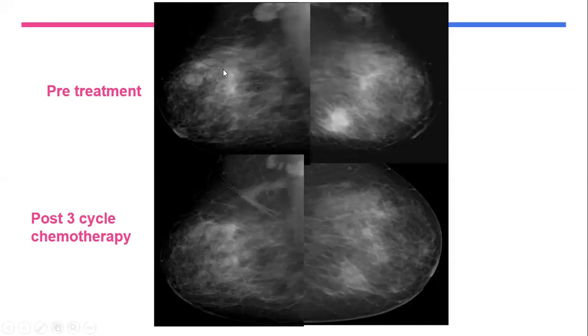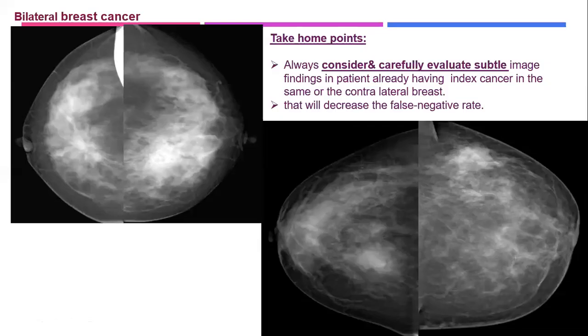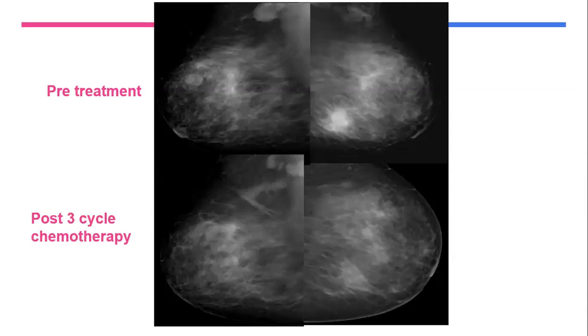You see, even there are some asymmetries, multiple asymmetries, and the one adjacent to the cyst regressed on follow-up. But I suspect this asymmetry, like in the contralateral breast, there are also a lot of asymmetries not proven to be suspicious for multifocal disease. That is why I suspect it is the same background fibrocystic changes. Okay, what raised your suspicion previously that this was a malignant finding? The regression of the cyst size and the lymph node?